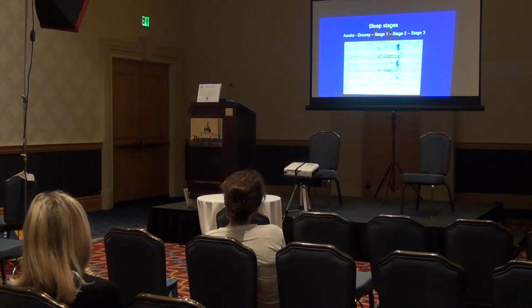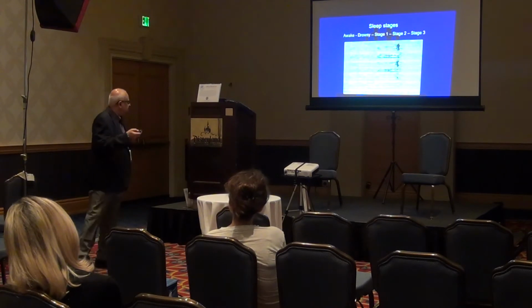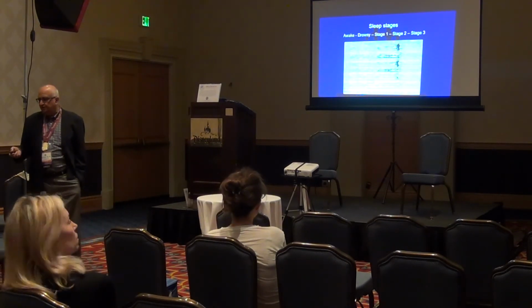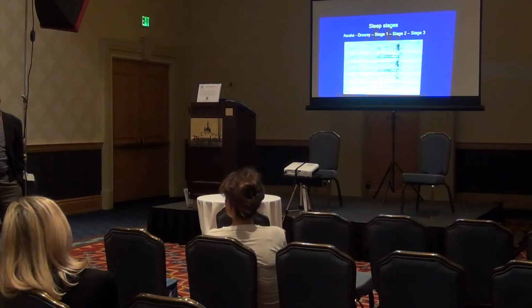Okay? So this is a good example. You know, an experienced encephalographer would say, oh yeah, this is a pretty good awake recording. To them it looks really normal. To you it looks kind of noisy, not very clean, right?